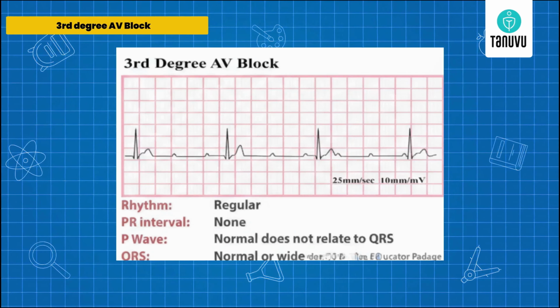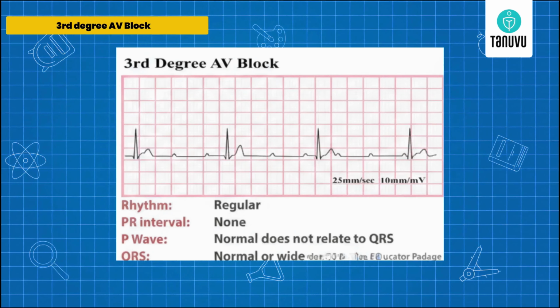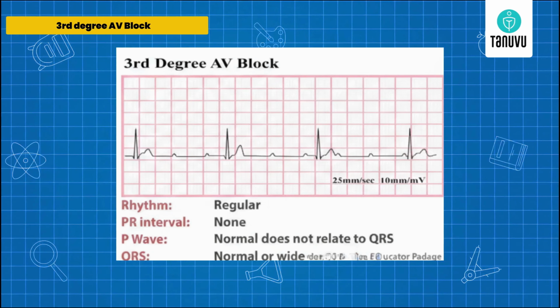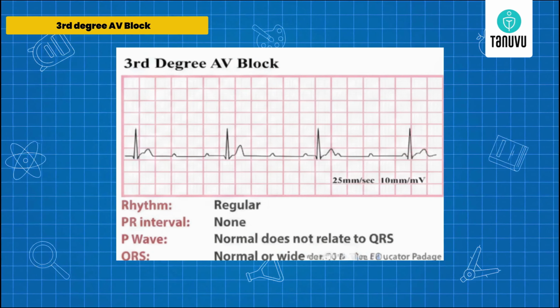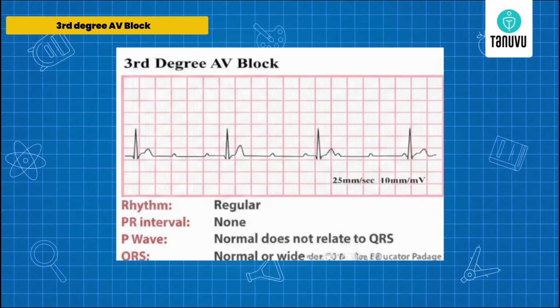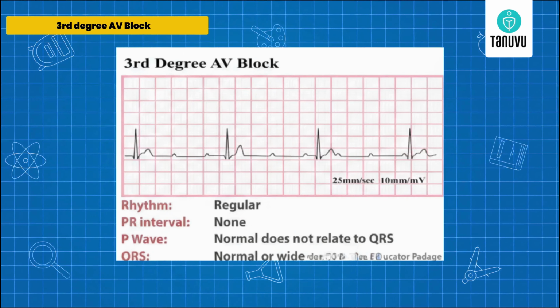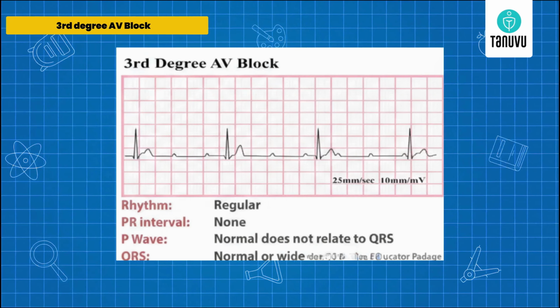The third degree AV block is AV dissociation. That means atria conduct at their own rate and pace and the ventricles are conducting at their own rate and pace. It can be called as no talk, 2 clocks. So this 4 complete the common AV block abnormalities.